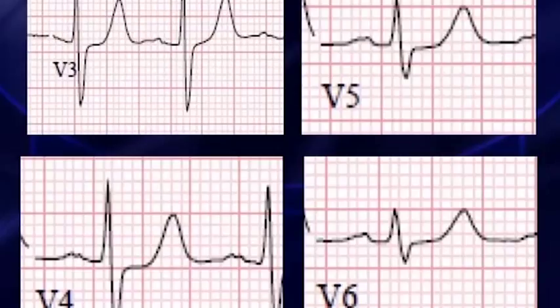And when you blow these leads up in front of a jury, suddenly that tiny bit of ST segment change can become very, very obvious to a lay jury. They'll look at that and say, how in the world did you miss that ST segment depression? Even non-physicians, a lay jury can pick up the ST segment changes that this person missed.